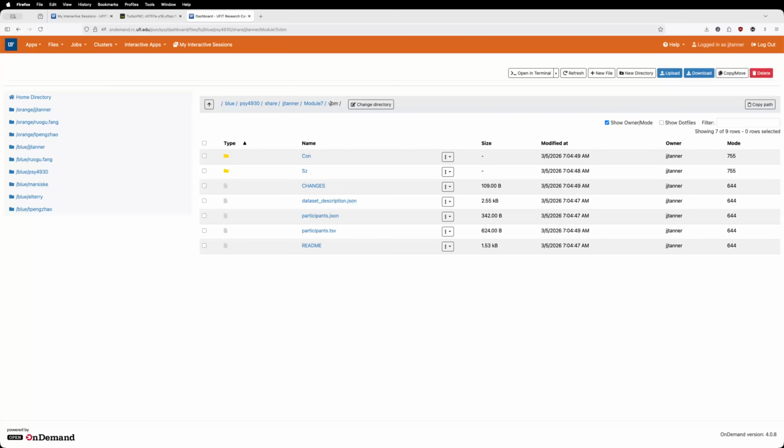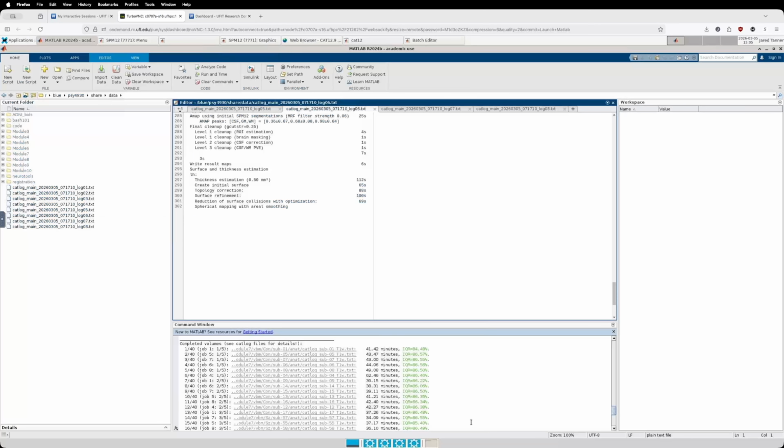There are different ways to do it. You can go one by one through the folders. You can look in the list here and say, okay, looks like 2, 3, 4 didn't finish, 6 didn't finish, although 6 is right here under 7. These aren't all in the exact order, so you'd have to be careful going through and trying to find the ones that didn't finish. You can be meticulous and do that one by one, or there's a shortcut. If you want the shortcut, there's one command we can run.